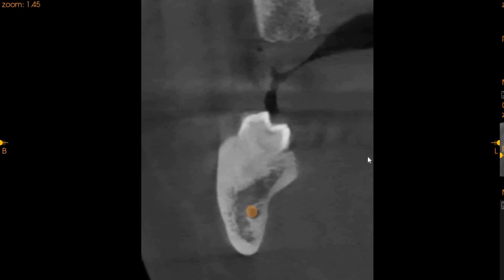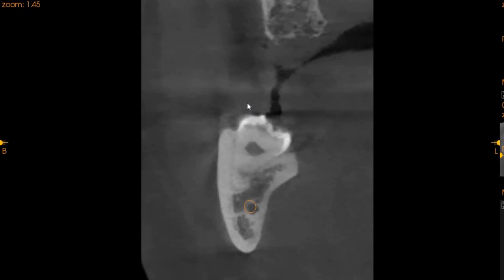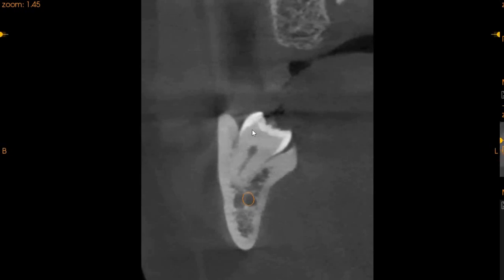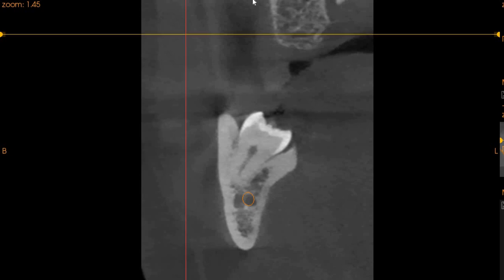There seems to be an ankylosis of the wisdom tooth with the buccal cortical plate. So this is something that needs to be very well understood before attempting an extraction, and you can clearly see at 150 micrometers there is very little periodontal space between the lower left wisdom tooth and the buccal and lingual cortical plate.